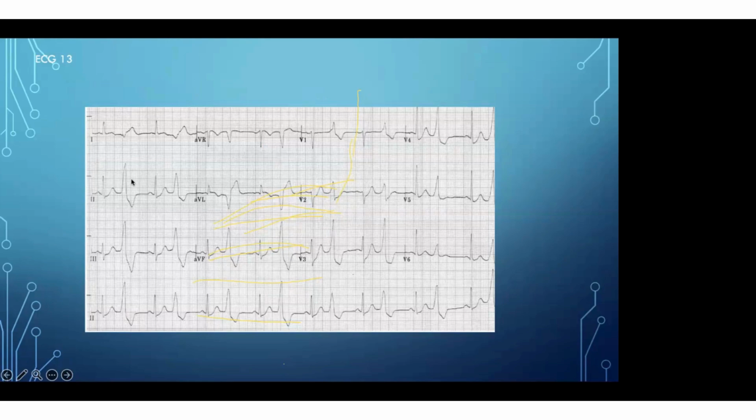So when you see a ventricular premature contraction, we can stratify whether it will produce an arrhythmia, because if it falls on the T wave, the R on T phenomenon, then it can cause a torsade rhythm or it can go to ventricular tachycardia. From the morphology of the VPCs, we can predict where they are coming from.